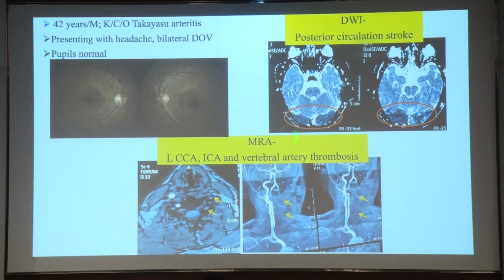In this, angiography was done. You find on the right side you can see this intact channel of vessels, but here it's all gone. The carotid arteries, internal carotid and vertebral artery, were all thrombosed. So that led to an extensive infarct.